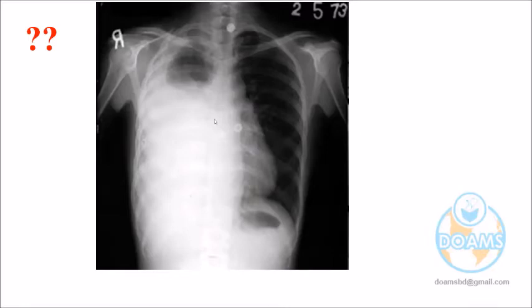Dr. Abdullah is telling that it may be lower lobe, middle lobe, or both consolidation, an unusual combination though. In the white area, if there is a curvilinear line, the shadows are white and we cannot differentiate it from consolidation, especially in this picture. But sometimes if there is more water, you cannot see the ribs also. If the ribs are not visible, more likely there is water or blood. Any curvilinear line at the upper part of the consolidation is more likely pleural effusion.